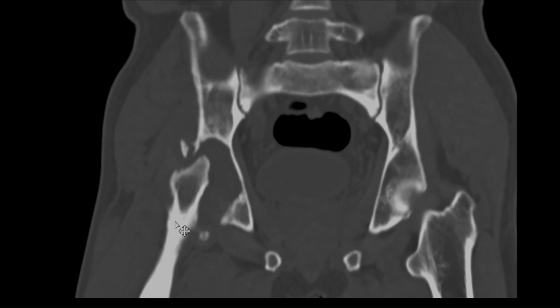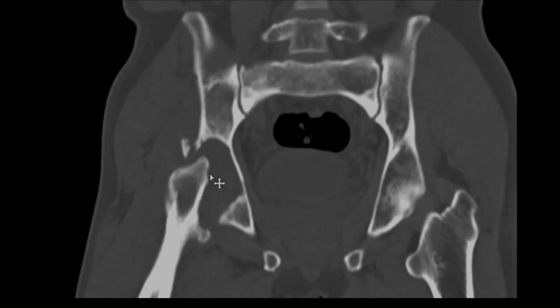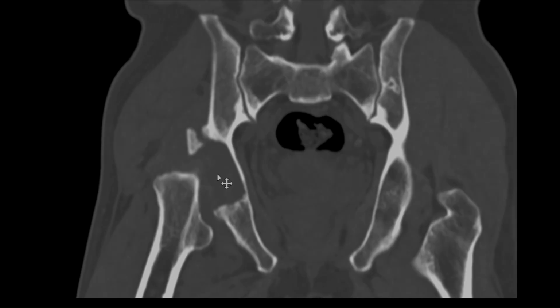So this is how post-traumatic osteolysis looks. It should not be wrongly reported as a type of septic arthritis. This is just how an ignored traumatic injury in the subcapital region usually appears after some period of time.